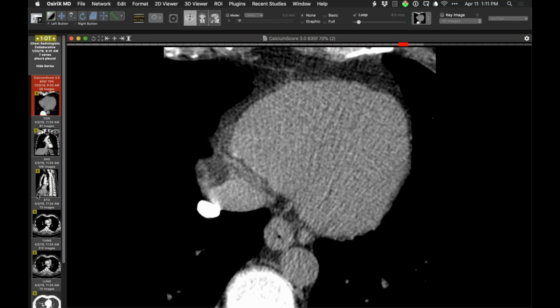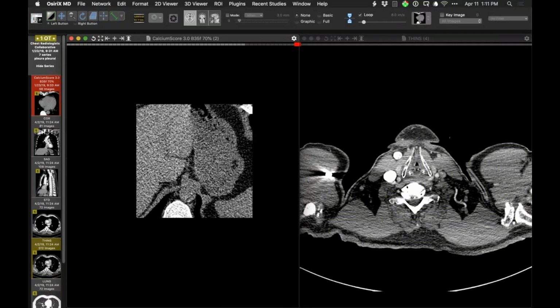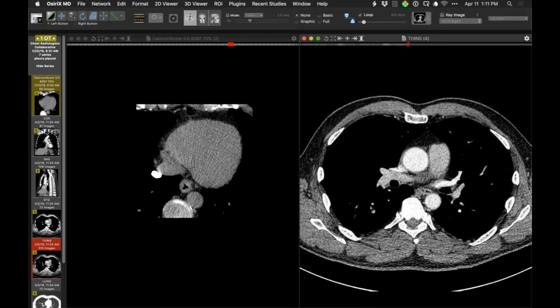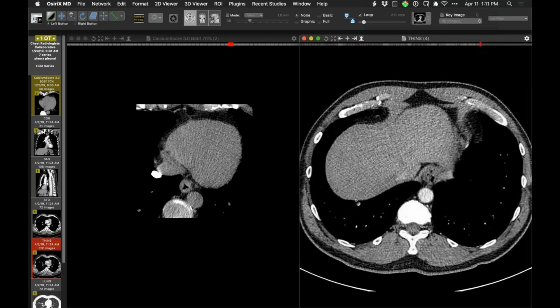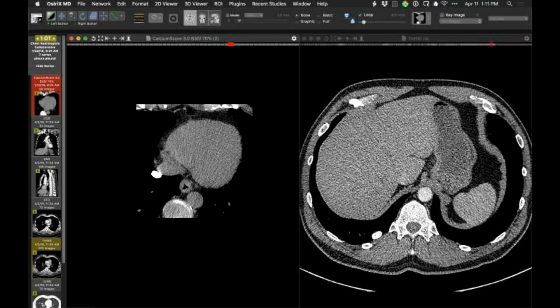So that's January, and the follow-up is April. So I'll bring up the follow-up alongside it. And let me just go back to unsync those. So what I'm going to do now is say I started looking and I said, oh, where is this thing? Didn't see it, and then said, oh, there it is, down there.